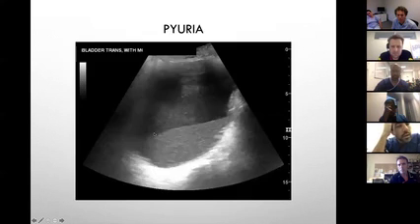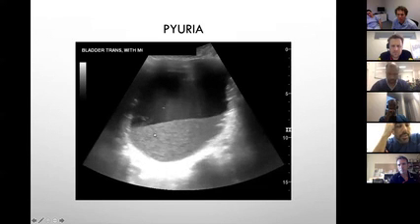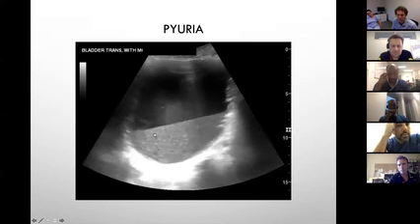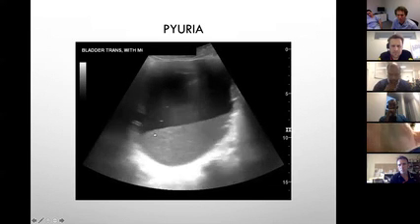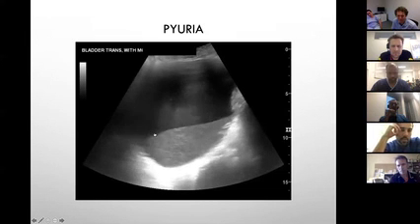Can I ask, if someone's got a fair amount of blood in their urine, sitting in their bladder, will it look similar to that, or will it be completely different? Okay, what do you think about this one? I've got the slide, the next one, for what you're asking. Can it be blood?